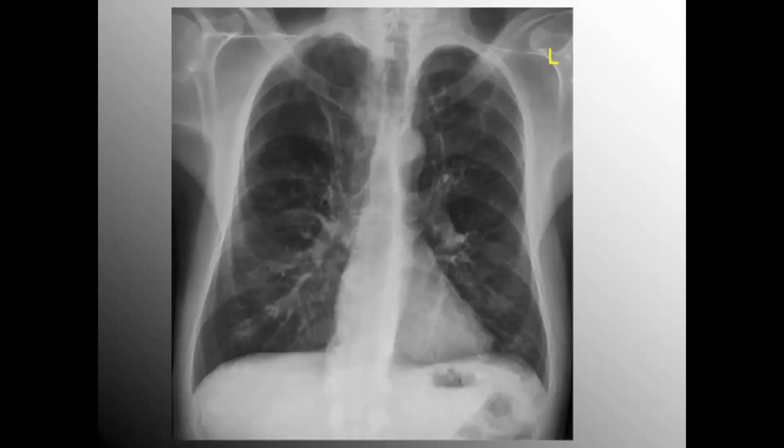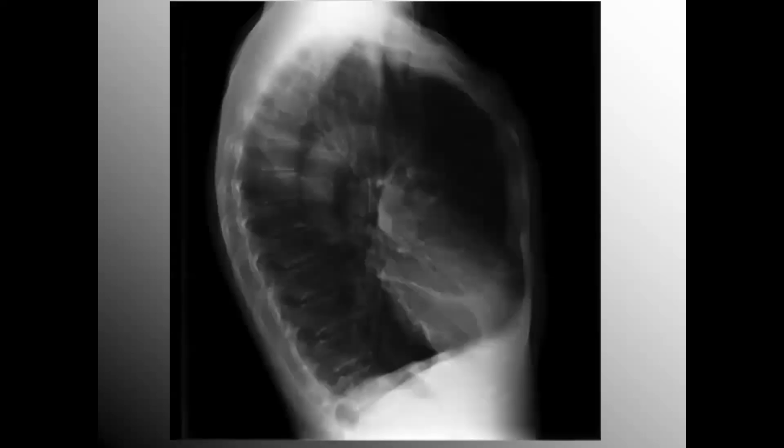So here's a lateral film of the same patient at the same time as the frontal view chest x-ray. And note the hyperlucent, or the dark black, and that really prominent retrosternal airspace. I mean, this is barrel chest if I've ever seen it. Here's that retrosternal airspace, and look how beautiful the aorta is shown here. You don't see that very often.